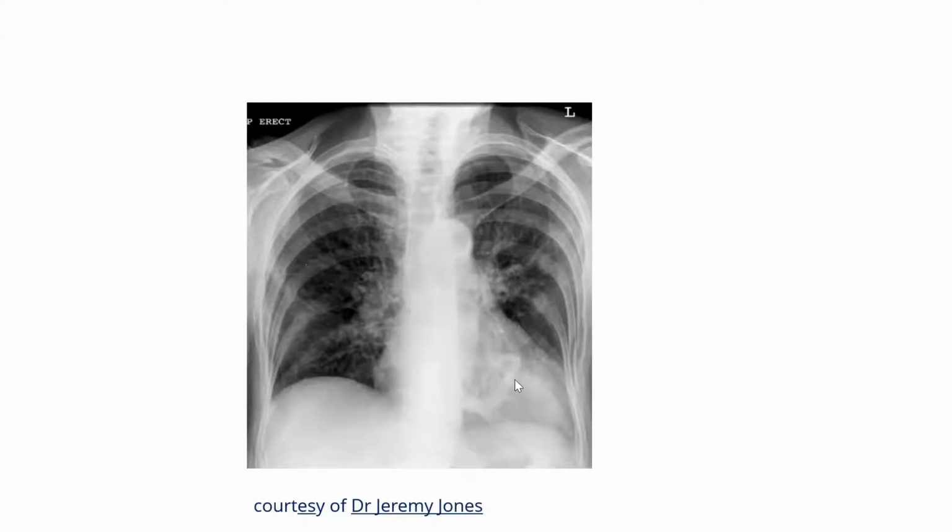This is mitral valve calcification. And if you look here, it's kind of curvilinear because it's tracking the annulus. So this is mitral annular calcification. Sometimes you feel it's standing out like a prosthetic valve. Okay, so this is mitral annular calcification. Okay, good.